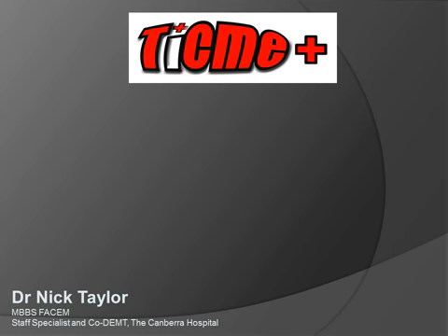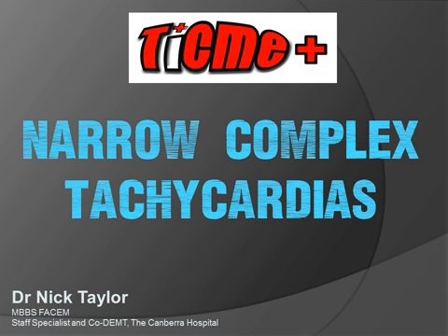Today's tutorial is one of our TiCME Plus series, so slightly more advanced, and it's all about narrow complex tachycardias. This is part of a pair of talks which includes wide complex tachycardias as well. Remember when you watch this movie that at any point you need more time to look at an ECG, you can just pause the movie.